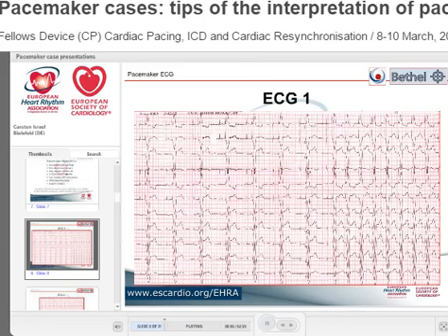So, whenever the pacemaker is pacing inappropriately fast, this is always pacemaker-mediated tachycardia. Also, when you have atrial fibrillation and this is tracked at 120 beats per minute, this is also pacemaker-mediated. So it's a very clever answer, because when it's fast and you see pacemaker spikes, it is pacemaker-mediated. Wonderful. It doesn't tell you the complete mechanism. That's what I would love to hear from you.